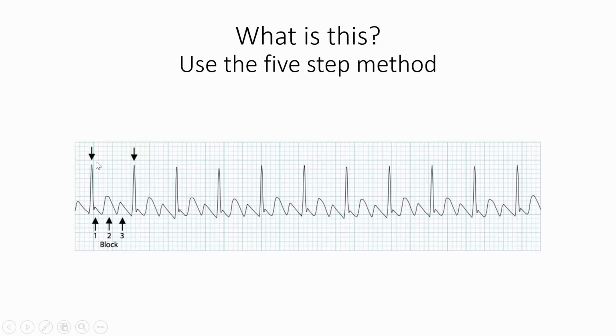Okay. So the first step, remember, is we are going to find out what the rate is. So 1, 2, 3, 4, 5, 6, 7, 8, 9, 10, 11.